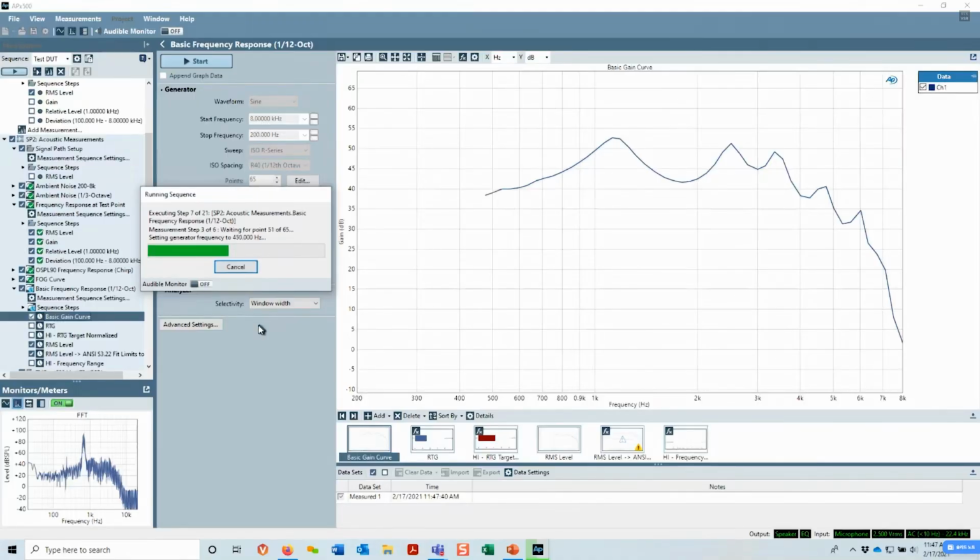And now we're measuring the THD at the 4 different frequencies. First 800 Hertz, 1.6 kilohertz. We did 500 already, and finally 3.2 kilohertz. This is the HFA at 50 dB SPL and the equivalent input noise. This test is the steady state input output. Then the attack and release measurement.